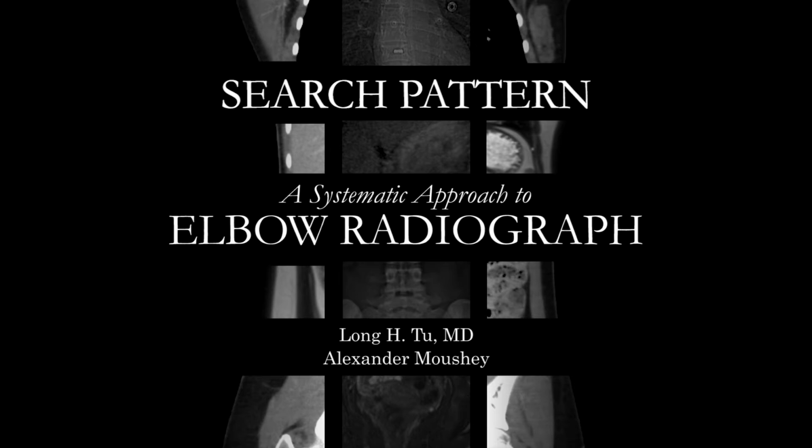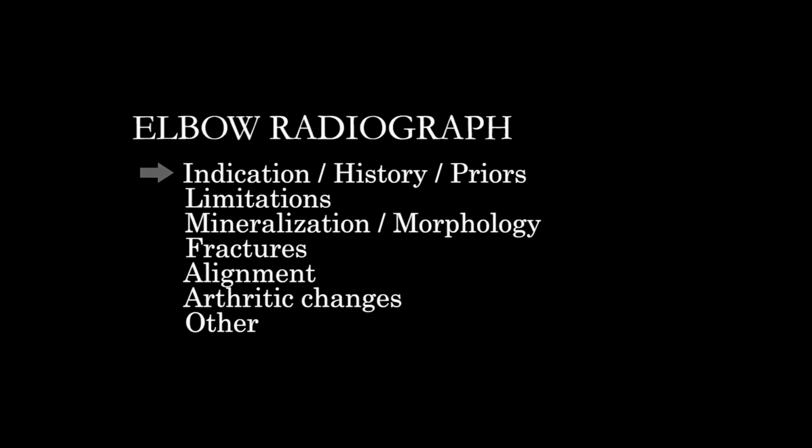Like with all studies, the overall organization will start with looking at the history, indication, any sort of prior studies. We're going to take a look at the overall study technique, any limitations, look at the overall mineralization or extent of abnormality as well, morphology of the bones, and then go through and carefully look for fractures, issues with alignment, arthritic changes, and then ultimately any other focal bone lesions or miscellaneous findings.